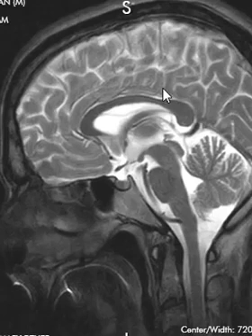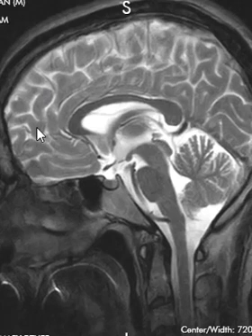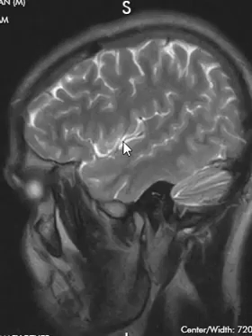Now if we zoom back out here, we can see the cerebrum. The cerebrum is up top here, starts up here in the front, and goes over the top and all the way to the back over here. This is the frontal region, this is the occipital region and back. We have the parietal region over here. If we go off to the edges, we have these areas called the temporal lobes of the brain.